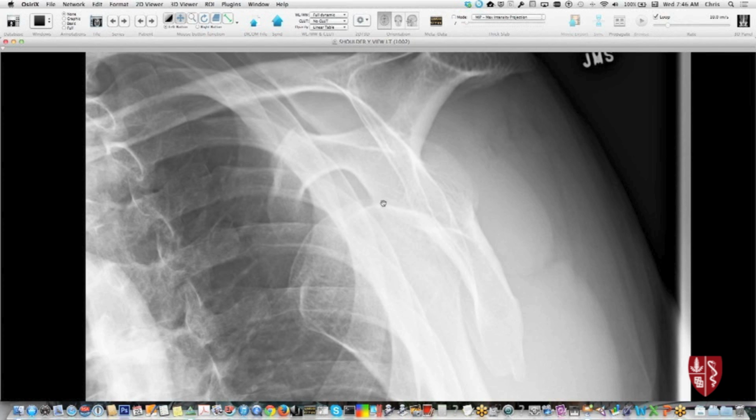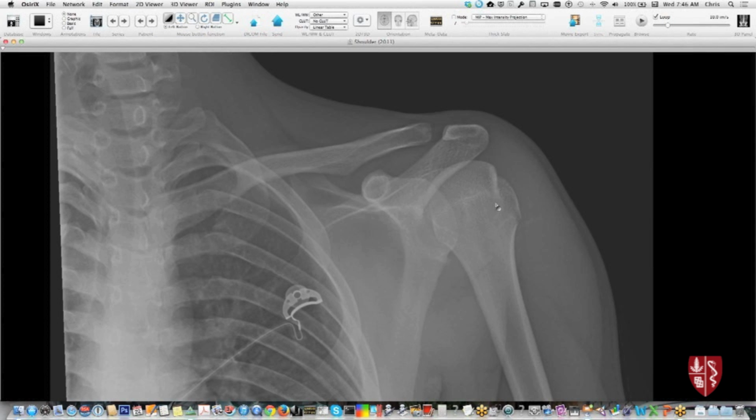is that with the humerus contacting the antero-inferior glenoid like this, you can have an impaction fracture on the humeral head that's called, as I'm sure you're saying to yourself right now, this lesion here, which is a Hill-Sachs impaction fracture. And so it's kind of a hatchet-shaped deformity of the humeral head that's due to the humerus impacting on the antero-inferior glenoid. And often they don't show up well until the patient's been relocated. They show up maybe best on an internal rotation view like this one.